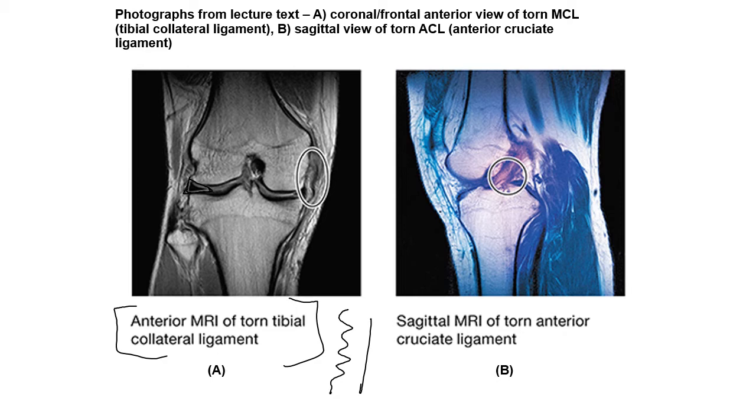In this case, this is a torn ACL. So the ACL should come down here, but it doesn't. It seems to be retracted back at this point. Oops, I'm sorry, that's not correct. I'm looking at the wrong view here. So it should be coming down this way, but it's actually flipped up here. So that's what all this is. So you've got a big tear. Next slide.